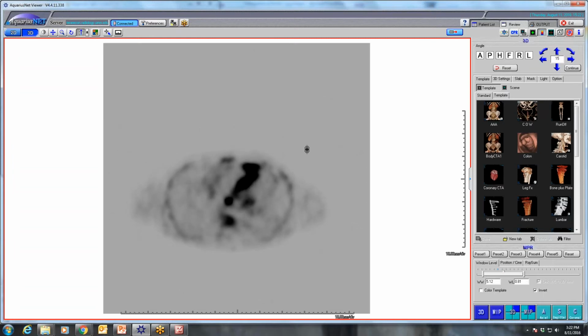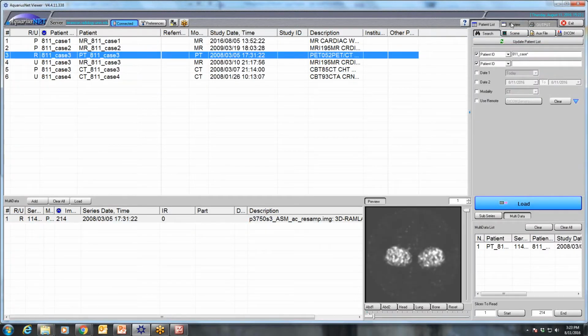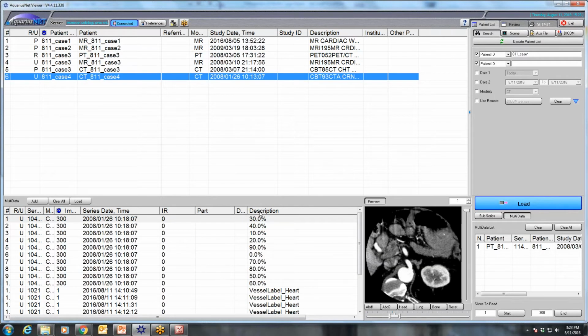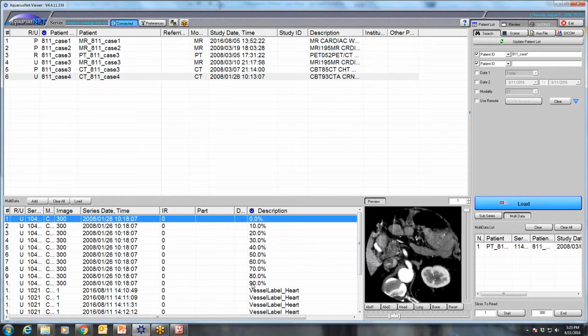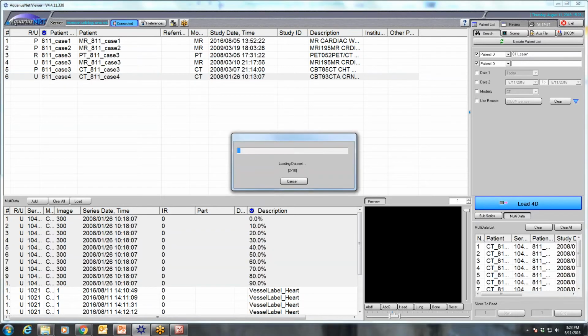I still am confused about the difference between leukemic and lymphomatous infiltration. I have seen a fair amount of cases of secondary lymphoma. This is the first case I've seen of truly, I guess, leukemic infiltration, although if one happens, it's not surprising that the other one happens. The MRI just shows a bunch of masses. It's impressive, but I think the PET is more impressive.